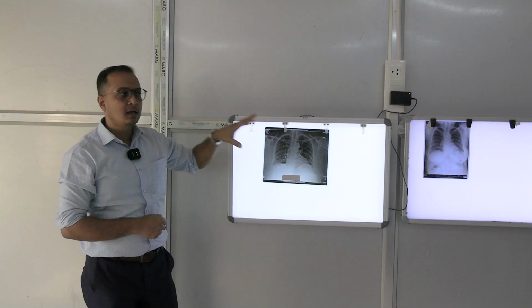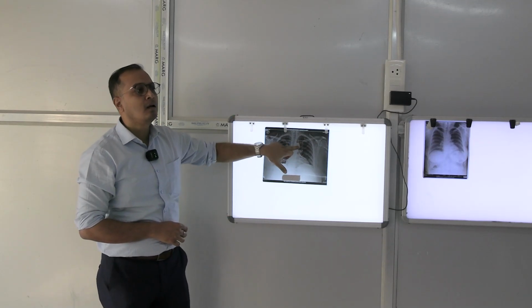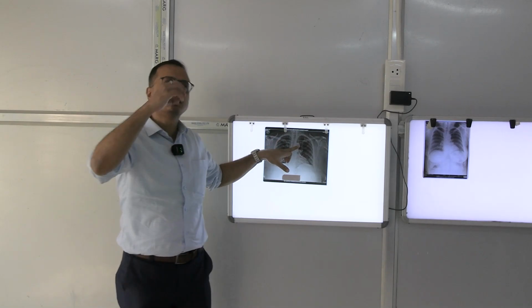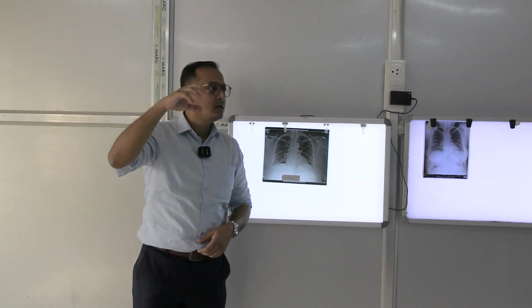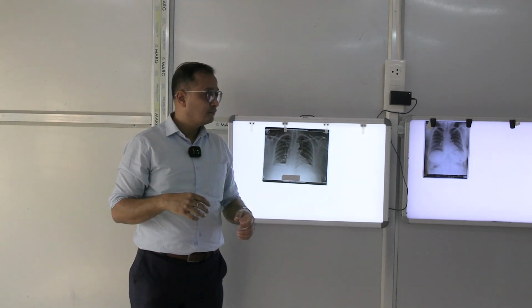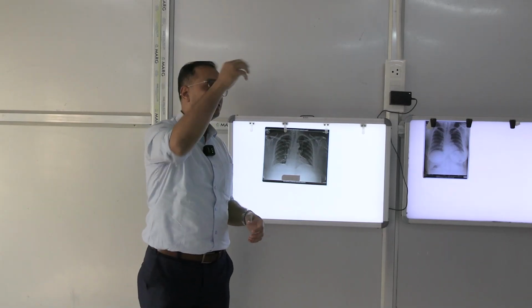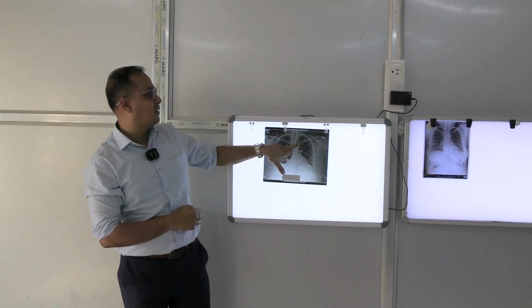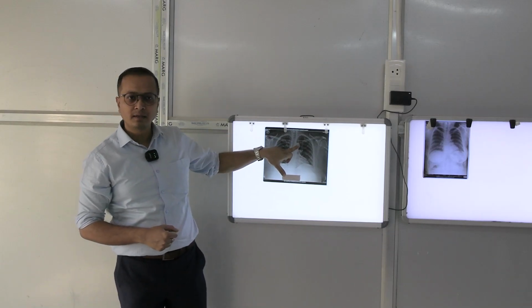So these are the elements you have to trace in the heart: right border, left border, inferior border, and the knuckle of aorta or arch of aorta. The knuckle is nothing but the arch of the aorta, arching backwards and making an elevation which looks like a hunchback. You have seen a whale. A whale has a hunch on its back, kind of elevated. That hunchback on the whale is the kind of hunchback that is present, and that's why it looks like a knuckle. This knuckle is present in this region, and you have to identify it.